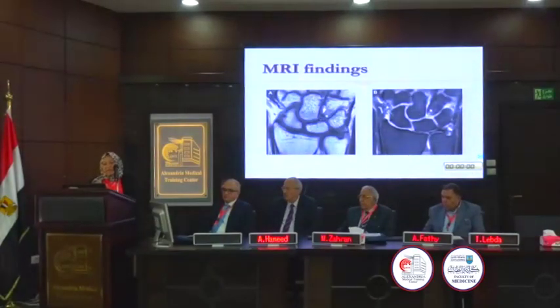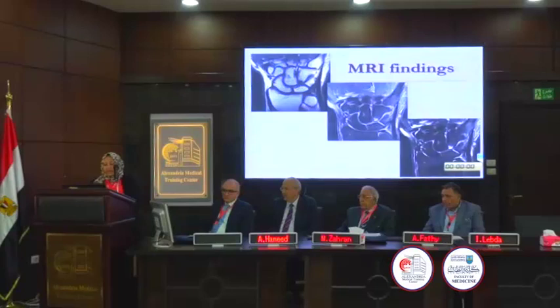So by MRI, we first identify the extra facet of the lunate articulating with the hamate with related chondromalacia and subchondral marrow edema at the proximal hamate. Again, the identification of this extra facet to identify the type 2 lunate and the related signal alteration of the overlying articular cartilage and the subchondral edematous marrow changes at the proximal hamate in the articulation surface.